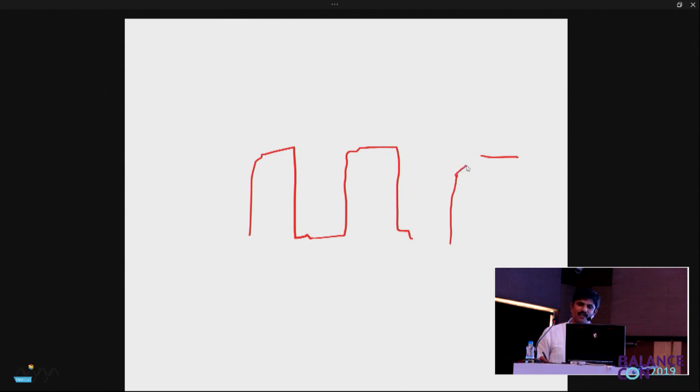It is taking a slow movement to reach that. Is that what you see? So these slow movements can be of two types. One is when it stops short, it reaches the target through a slow movement. Another is when it goes beyond the intended target and then comes back, sometimes using a slow movement. Both of these things are considered as glissades.